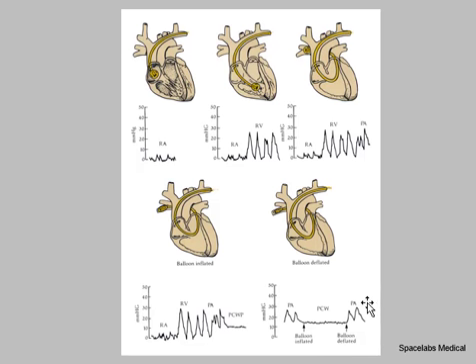This is a drawing illustrating how the catheter is advanced through the different chambers right up to the distal reaches of the pulmonary artery. In this instance, pressures are being recorded on the way in. You can see the biphasic right atrial trace. You should all know well by now.